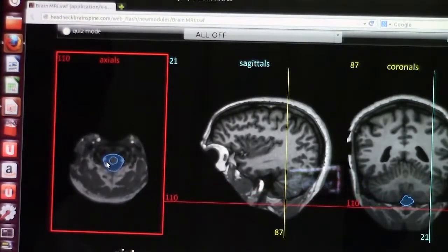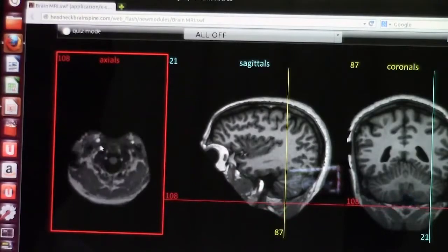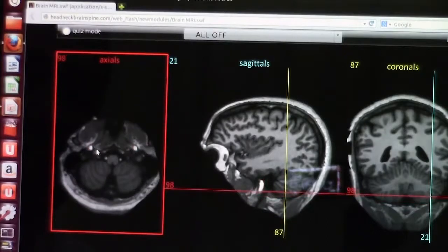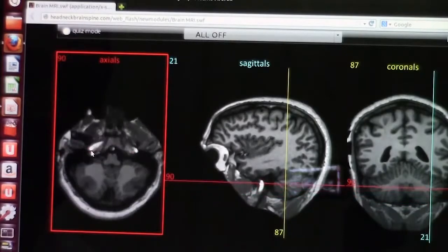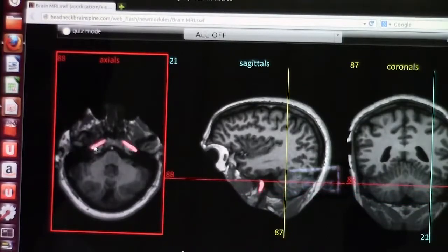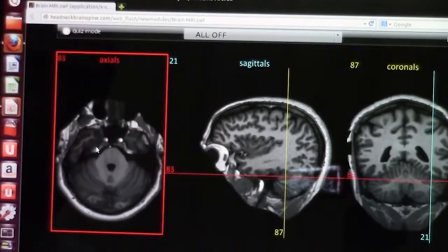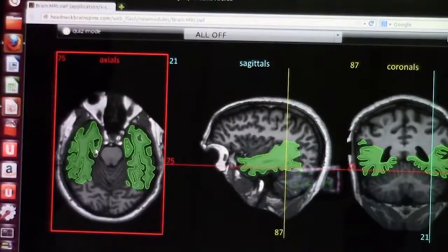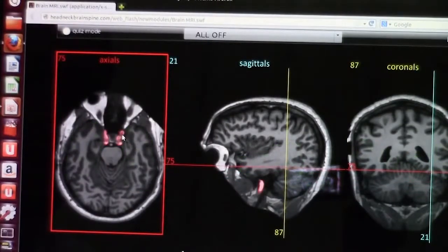This cut specifically is made with contrast. As you see, the carotid artery or the vessels are taking the contrast, and as you go up, we are seeing the carotid artery in the cavernous segment, and it goes up, and at this time it would give the ophthalmic artery.